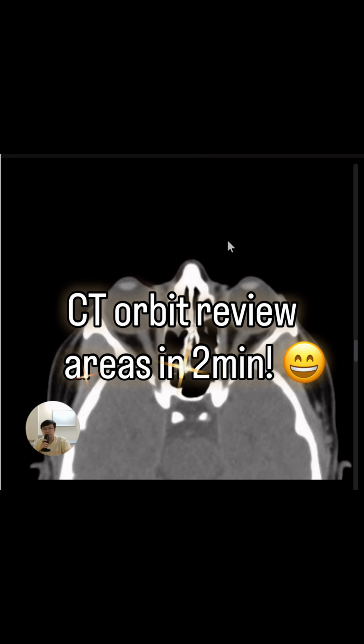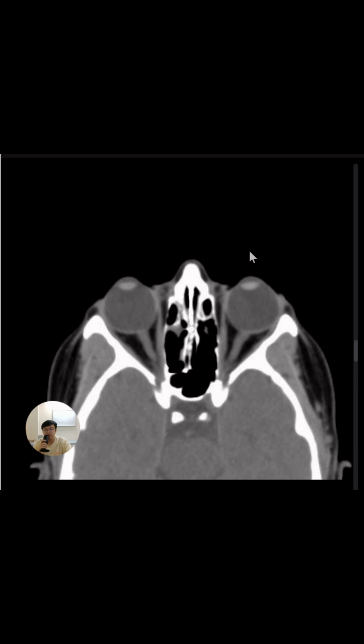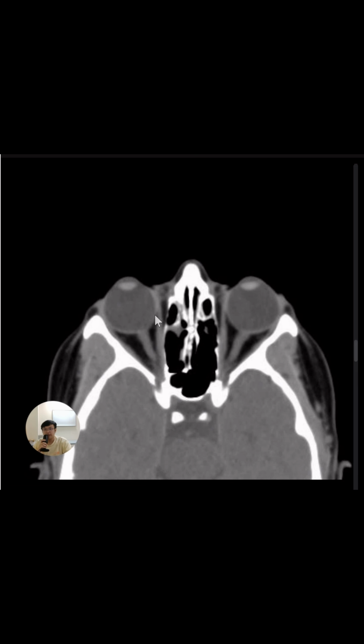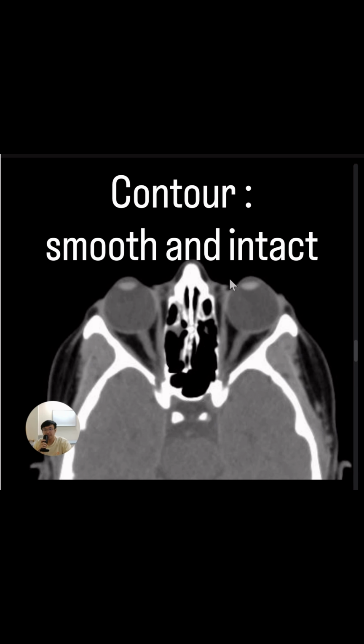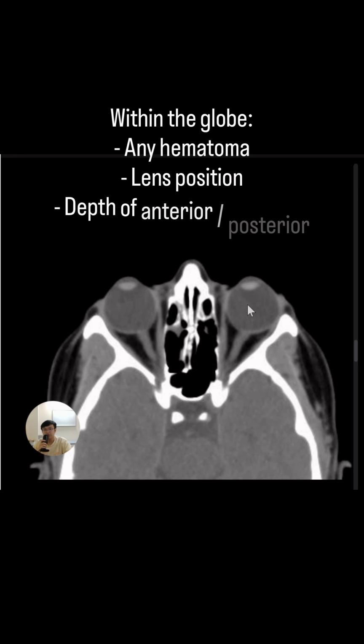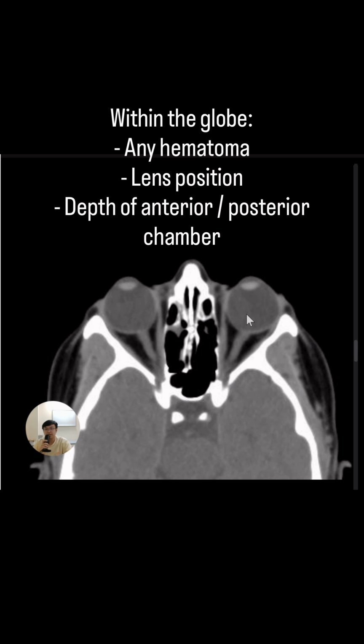So let's use 2 minutes to learn the review area of CT orbits. First of all is the axial soft tissue window. We first take a look at the bilateral globes. We should see very smooth and also intact contour of the bilateral globes. And within the globe, we should not see any hyperdensity to suggest hematoma.